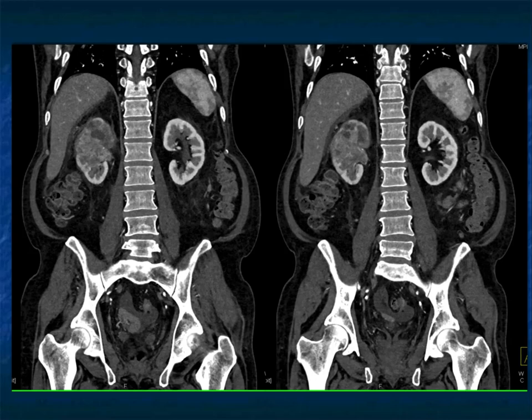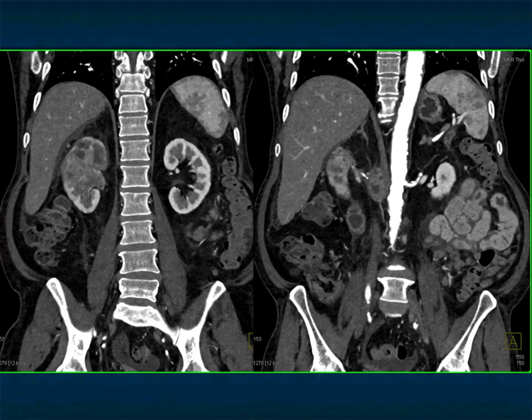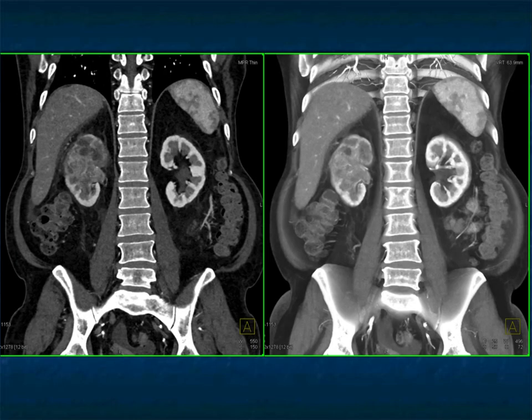And now you look at the upper pole, it still makes me think of a hypovascular infiltrating renal cell. Maybe you can throw in lymphoma. But the way the pelvis looks, whatever's happening is going to and into or coming from the pelvis, and probably in reality it came out of the pelvis. That's classic for transitional cell. Here's a few more images of that.